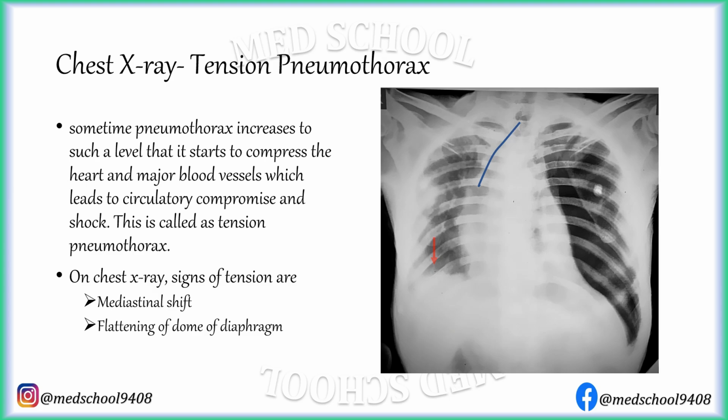I want you to note that the diagnosis of tension pneumothorax is made on clinical grounds. The presence of these X-ray signs can help in making the diagnosis, but they are not absolute. That means tension pneumothorax can also be there without these signs.